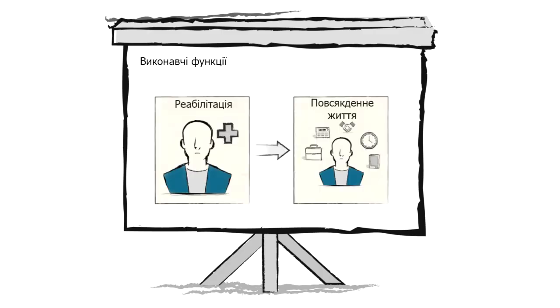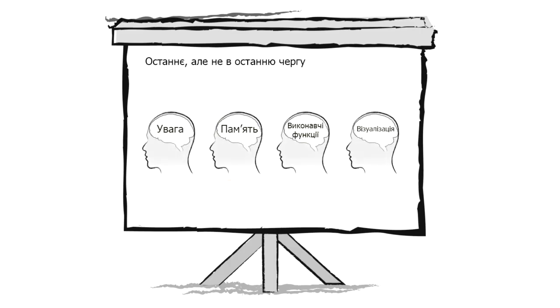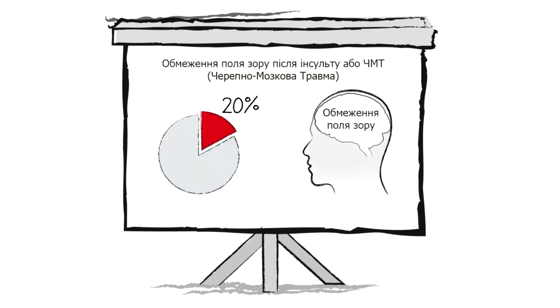Executive functions are important for the patient's return to daily life. Here, abilities like planning and logical reasoning are trained. Last but not least, visual field deficits can be treated with RехaKom. Approximately 20% of stroke and TBI patients suffer from a visual field loss.